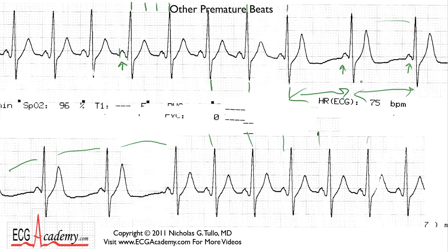And so you have to kind of ask yourself, well, is this a sinus node problem? Do we have sinoatrial exit block? That would be a possibility, because here you have sudden slowing of the sinus node, so potentially these sinus impulses couldn't get out to the atrium. So that's a possibility, but that one's not right either.